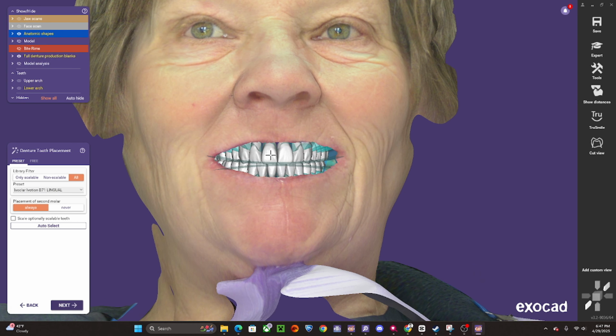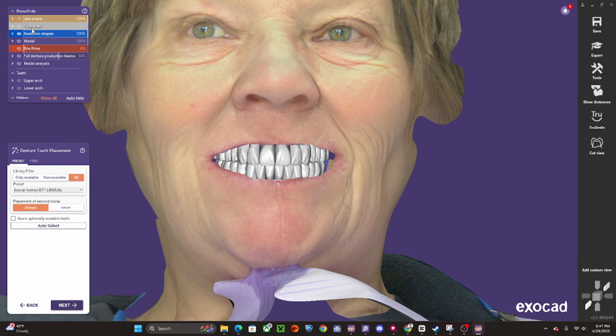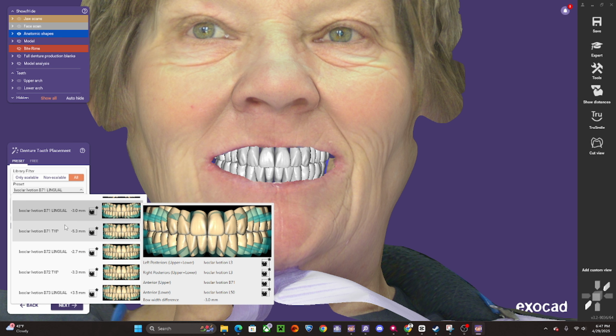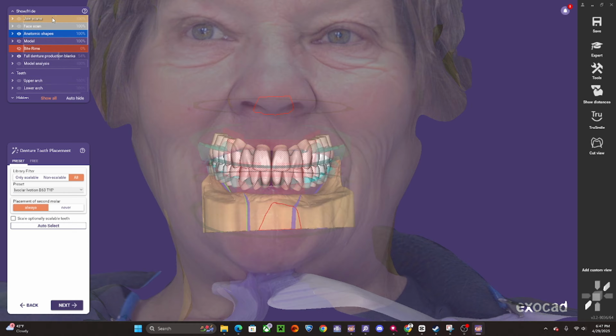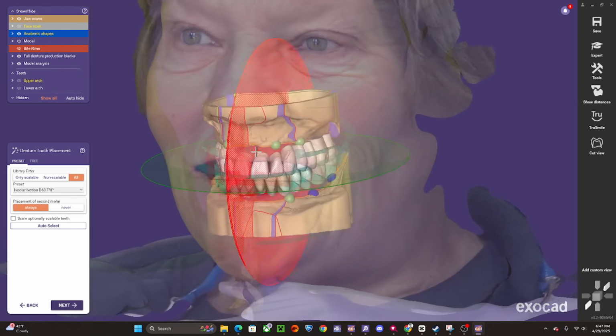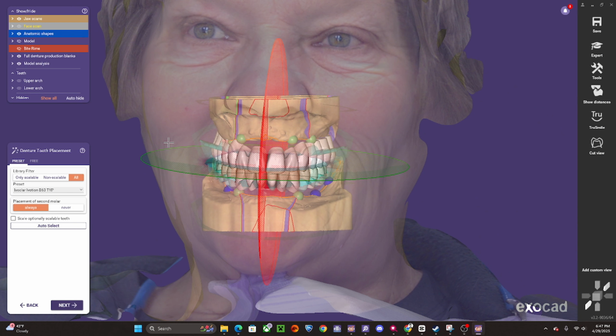Now we can hide all of these extra tools that we have in our show hide window, but we can keep flipping through your molds, and these molds have different sizing and face bow width differences. So it's up to your discretion on what you select on these cases, but be conscious of your jaw scans and the positioning of everything previously when marking these dots and everything.